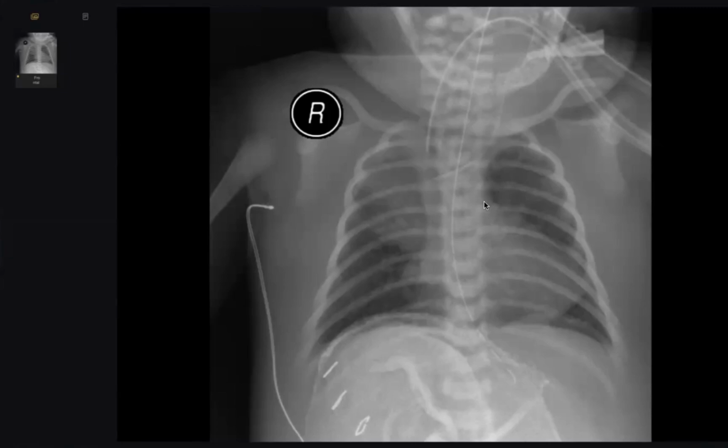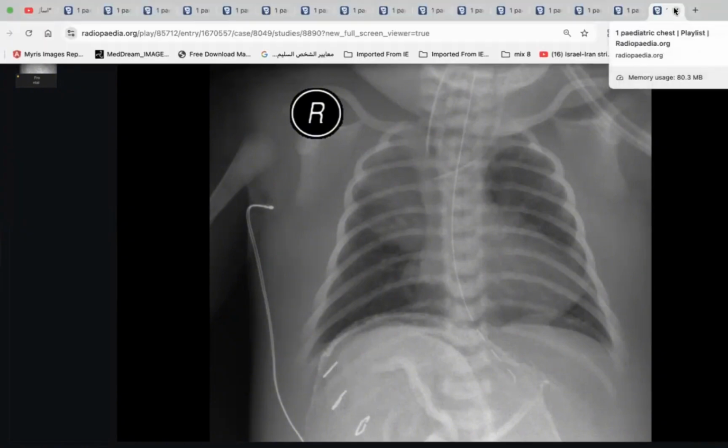So this is a consolidation, maybe infection, maybe edema. According to the clinical, we didn't have enough data here, just cyanotic. If the patient is feverish, it may be pneumonia, but the most important here is the boot shape heart. I think there is a blanket from outside, maybe something, we don't know. Thank you, doctor, so much. Next candidate.